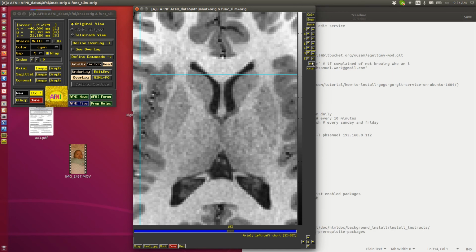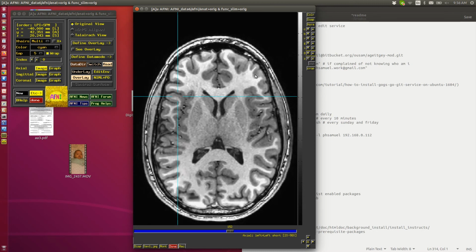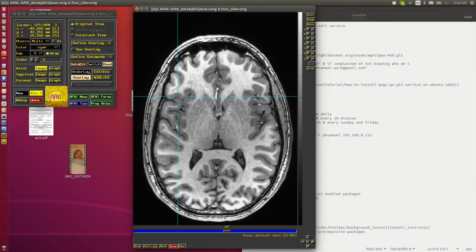And below that is a button called crop, which can be useful if you want to crop the image before you save it to a file or something like that. Of course, you can always crop it afterwards too.